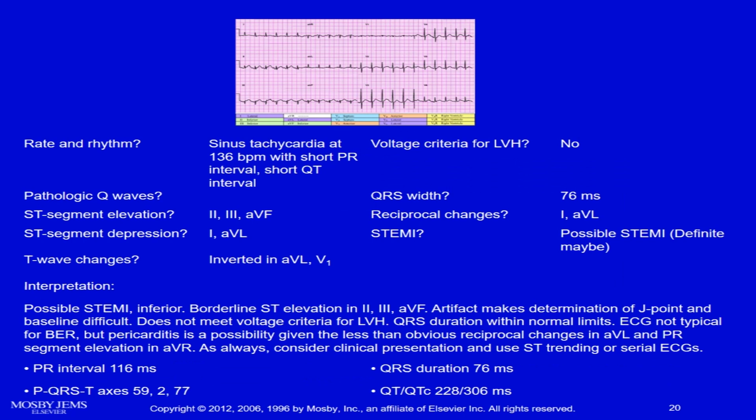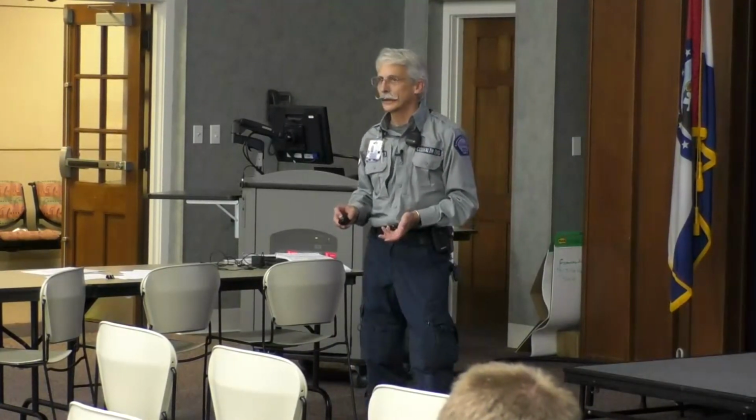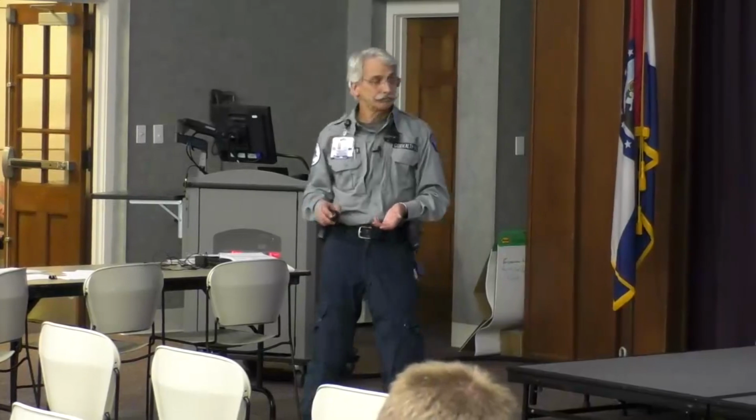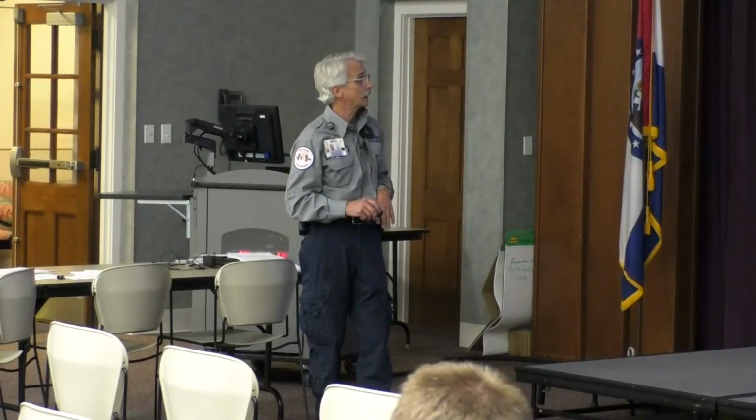Are they going up, or are they coming down? We can go back and look at the T waves, and they're kind of down, so it may not be early. It's pretty good to say, if you're getting called to the scene, it's going up. When did your chest pain start? When did you start feeling funny? But we're going to call it that.